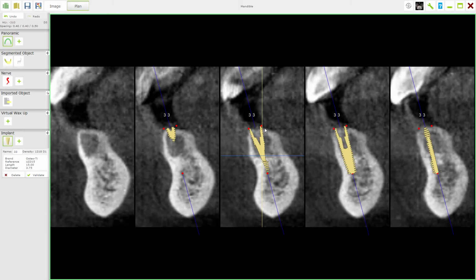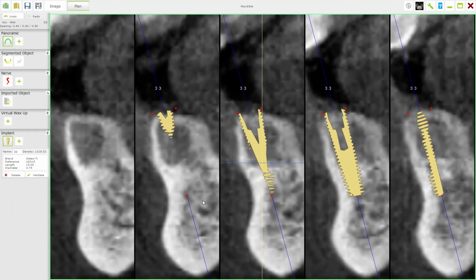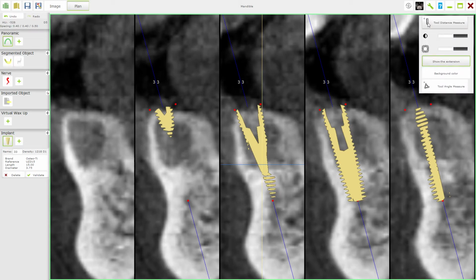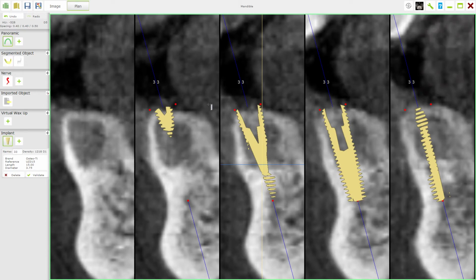You know, right, I'm going to feel some resistance to start with, and it's going to be quite a bit of resistance. And if you want to be even more mathematical, and those of you who like this kind of thing, I can click on here and zoom up on the image a bit. I'm pressing on the roller ball and I've zoomed up that image by pressing on the roller ball and moving the mouse towards the screen. I can go to my measuring device and click on the measurer, and now I can position. You see that little cross? I can click on that and position that, and I've made a little dot, and then I can click on it again and move the next bit to here.